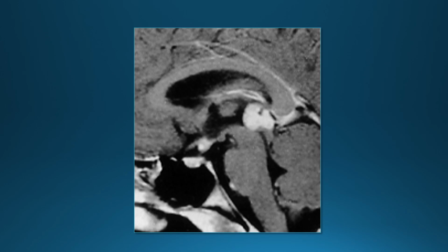If you see a lesion both in the suprasellar region and in the pineal region, almost always we're dealing with germinoma. I don't know if this is two germinomas separately or one metastatic to the other, but if you see both suprasellar and pineal enhancing masses, that's almost always going to be germinoma.